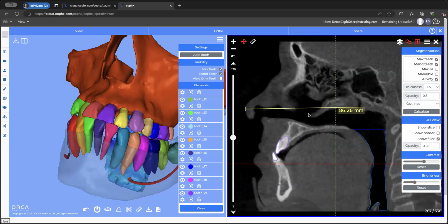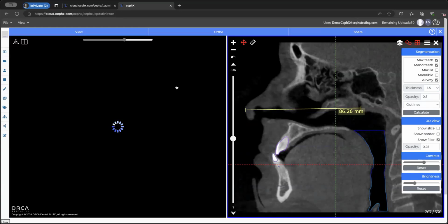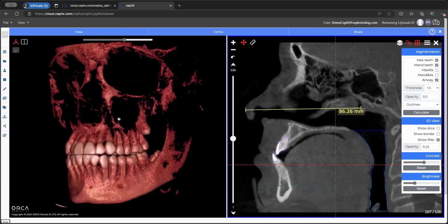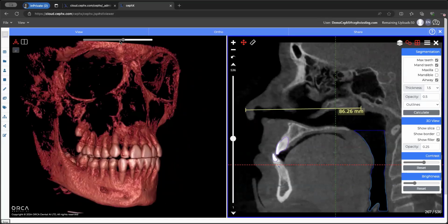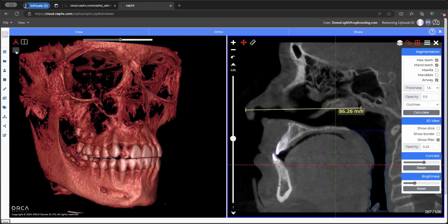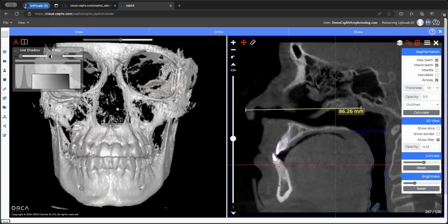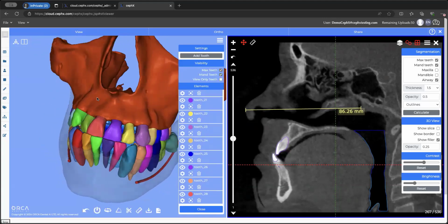All in all, it's quite a standard DICOM viewer. The speciality here is that again, everything's available by the browser. You can even look at the regular, so this is the actual DICOM image. I haven't seen that anywhere. The ability to actually see the original DICOM image, plus the kind of ability to filter. And if you want, you've got all kinds of extra controls and abilities to play around. But the idea is that we want to give all the tools to allow you to view your imaging.